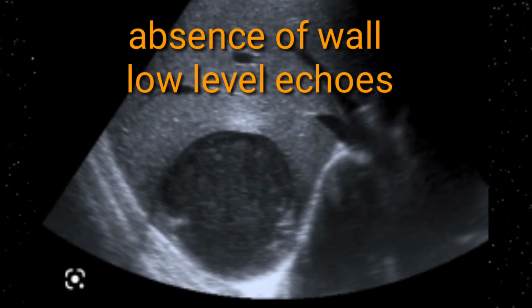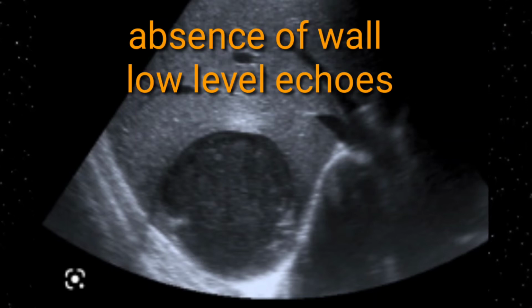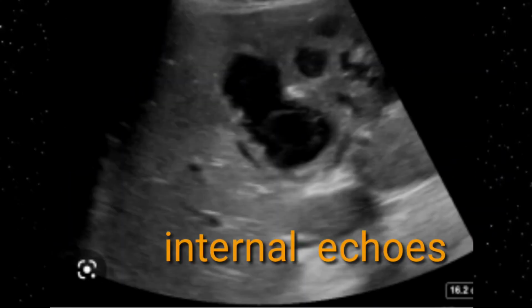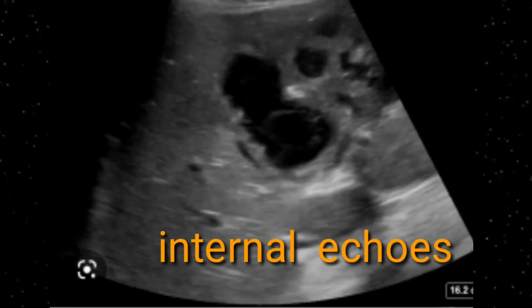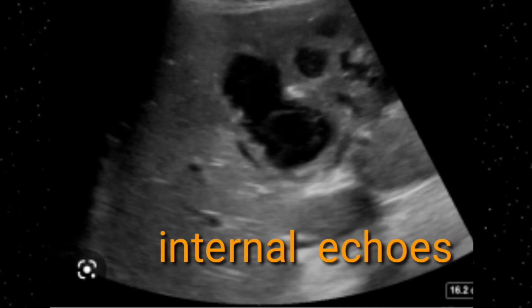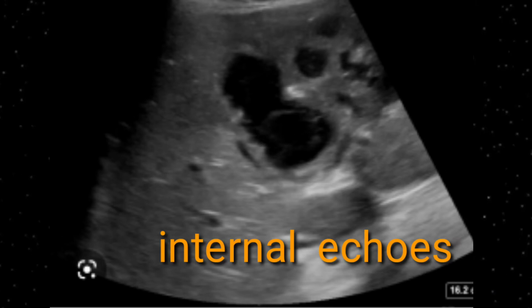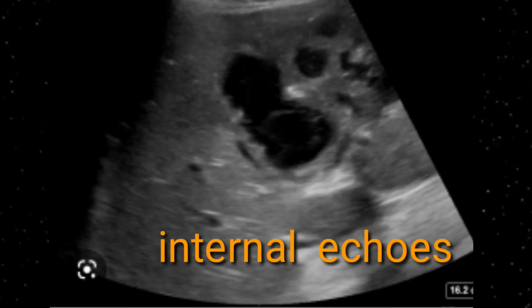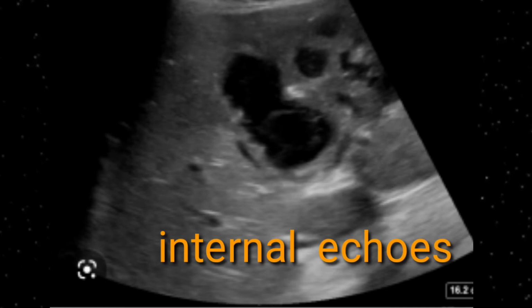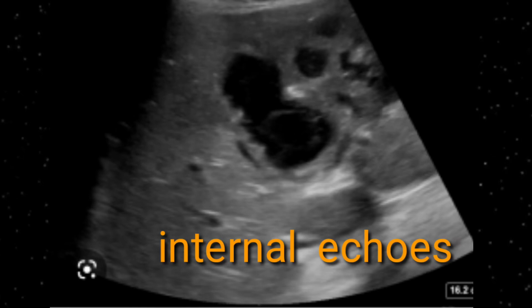You can't properly appreciate any thickening of the wall, so there will be no wall thickening, but within the cyst you can see the low level internal echoes. Here on this image you can appreciate an oval shaped small cyst, and multiple cysts rather, with low level internal echoes, and this is the classical example of amoebiasis. But you have to compare the diagnosis with the clinical features, ultrasound findings, and other serological and imaging findings.